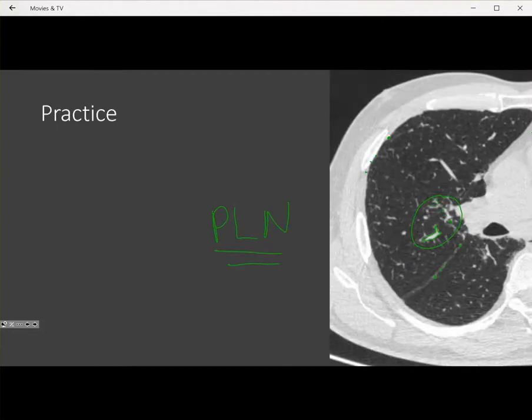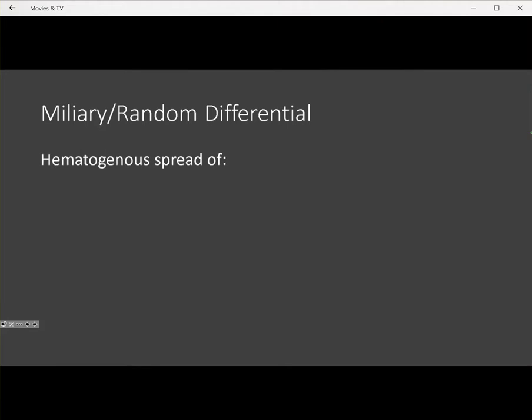Okay, so now I hope you guys are able to differentiate when looking at a CT via an algorithmic approach how to approach micronodules. The first step again is going to be to look if it involves the fissural and pleural surfaces. If the answer is no, and it clearly spares those, then you're dealing with central lobular disease. Central lobular disease can either be ground glass, solid, or tree and bud in appearance. If it does involve the fissural pleural surfaces, the next question you have to ask is it clustered? If it's clustered along a particular distribution, bronchovascular, septal, fissural, or pleural, you're dealing with a perilymphatic distribution of micronodules. If it tends to be evenly distributed, but also involving the fissures and pleural surfaces, then you're dealing with a random distribution of pulmonary nodules.